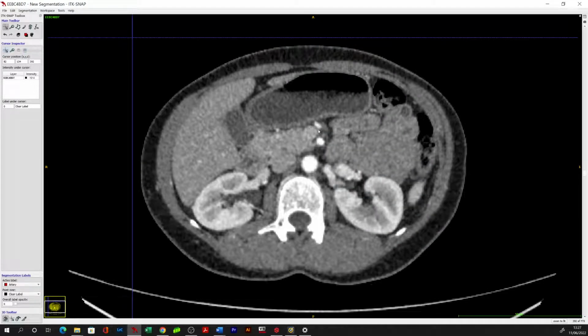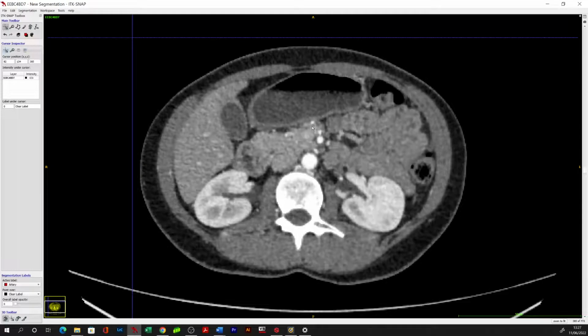So I think you've got a middle colic vein coming out here, which is passing anteriorly. And I think it's sometimes helpful, when you do have a difficult scan, to grasp towards landmarks that you already know are correct.